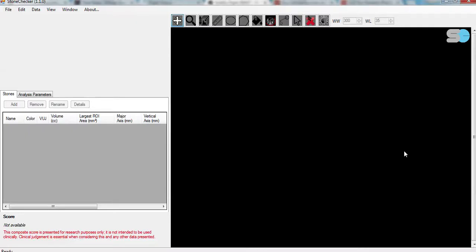Hello. Today I'll give you a quick demo of how the StoneChecker software works. So the software is a Windows-based application and works like any other Windows software.